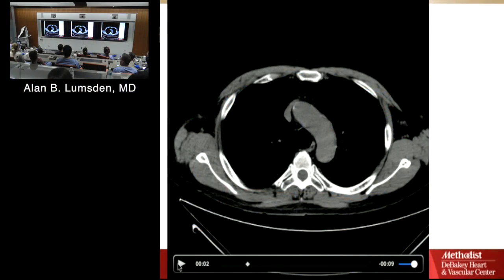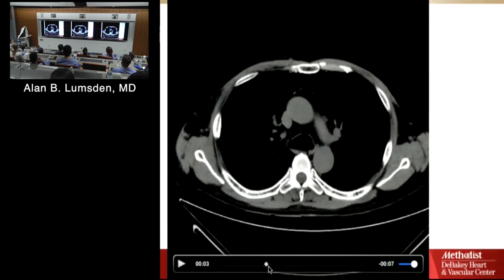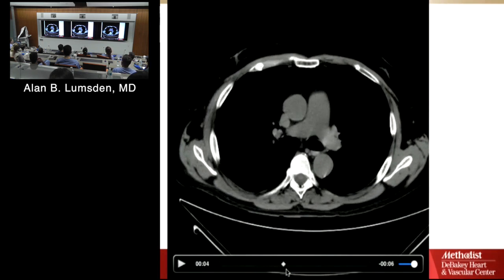CT chest. Yep. Okay. CT, contrast, no contrast. Why do we give contrast? Contrast to see vessels better. Yeah, you give contrast to your blood vessels. So it's usually a non-con CT scan. What is that? It's like calcium in the aorta. Calcification in the wall of the aorta by the looks of things.